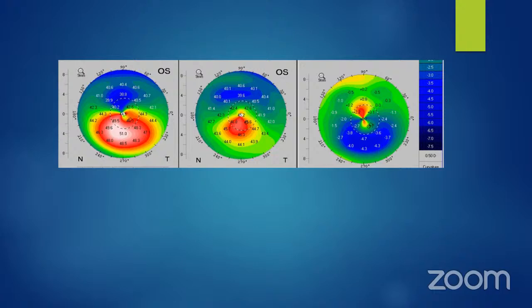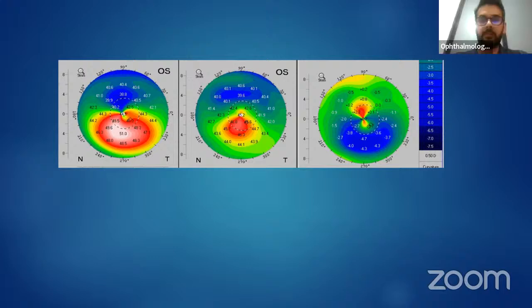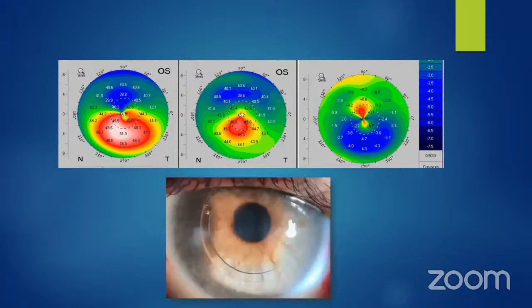Okay, when you're talking about keratoconus, the management is two pronged. One is to stop the progression and second is visual rehabilitation, which you will have to do with some other method. So this is actually causing a lot of flattening, right? Yes, so I'm giving you the hint when I'm telling you all this description. So what is that?